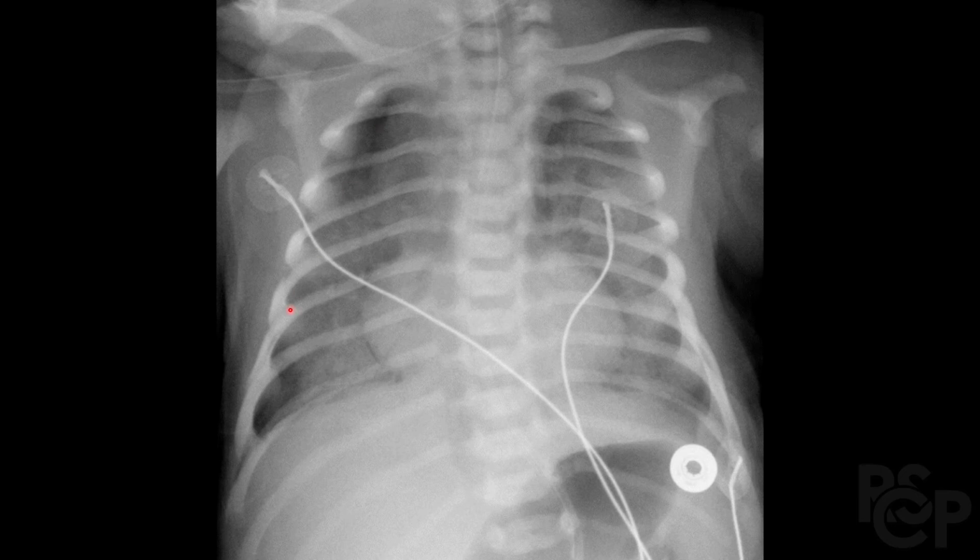Okay, so this patient born at term presented with respiratory distress. Start by identifying the lung volume, which appears to be normal on both sides. We notice this area of hyperlucency over here. This is likely indicative of a pneumothorax. We don't see that on this side, so right-sided pneumothorax. Pretty hazy appearance, diffuse pulmonary opacities bilaterally, which we can see over here.